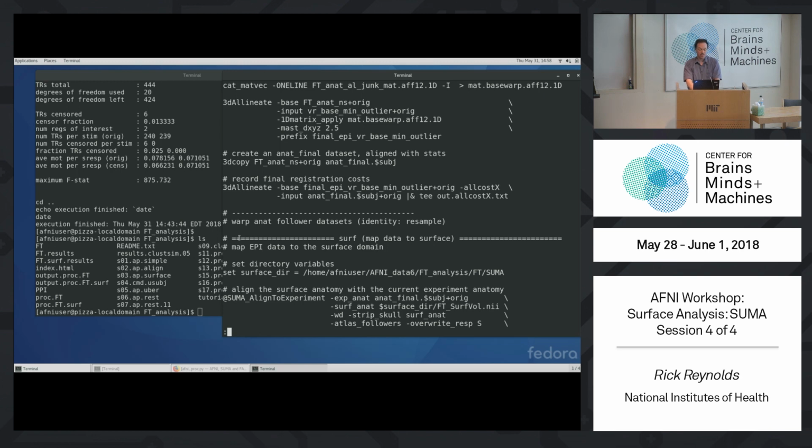That's great. So that's just the same as before, except for the standard space stuff. Any questions up until here? So is that clear? The EPI data now will be slightly different from before because we haven't gone to standard space. But other than that transformation, it's identical.